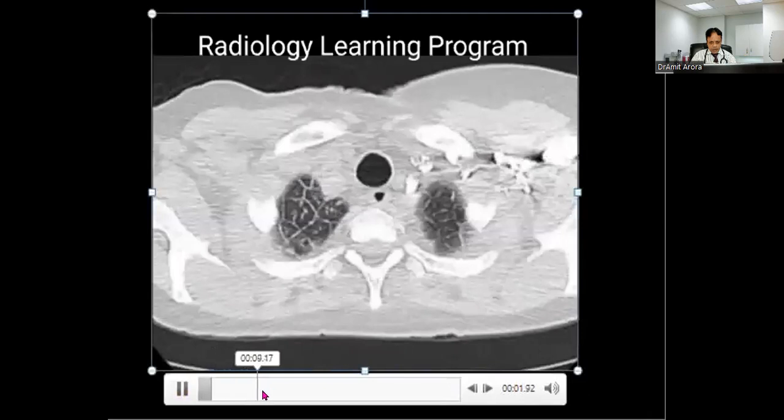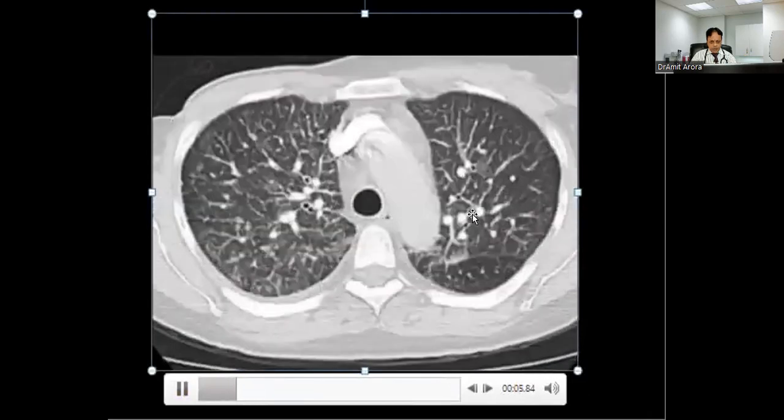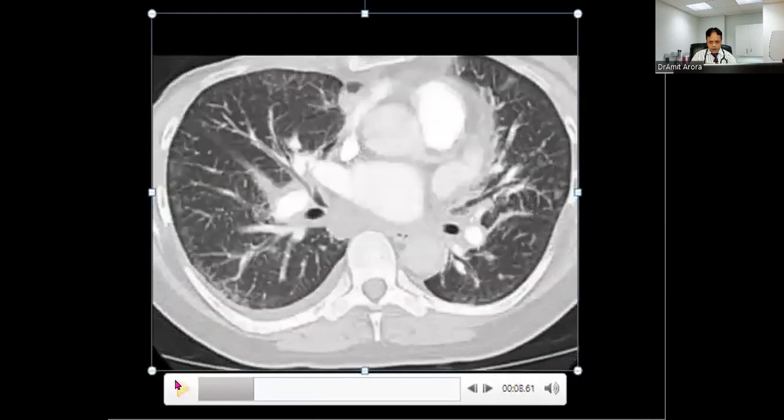Although I have a clip, there is no sense in showing it. You can already understand from the previous clip. So this is how it looks in a clip.